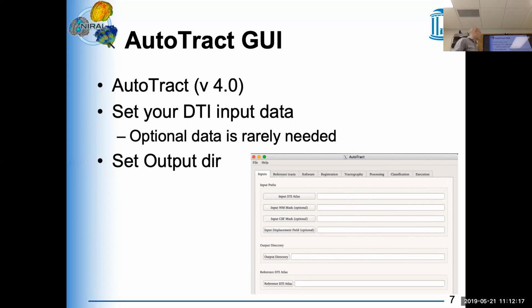If you feel that you want to specifically tell the tool where is only white matter, you can do that, or where is the CSF. The reason these are used is that when we do the tractography, we restrict the tractography within the white matter, and it's not allowed to go outside the white matter and into the CSF. That's why we have these two masks. In general, these masks are automatically determined by the program, and they're determined generously. And that's perfectly fine in the usual way.